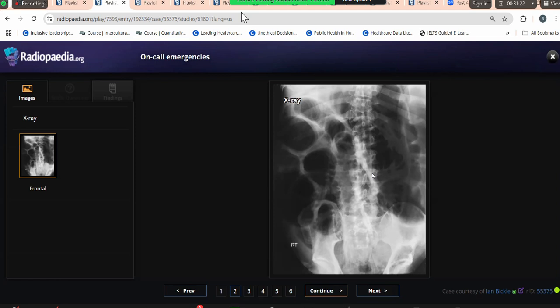So it appears to be obstructed. Yeah. So I would be thinking of the cecum, that it is arising from the left flank and extending towards the right side. This is in keeping with a distal large bowel obstruction, because I can appreciate both the large bowel as well as the small bowel, and I do not appreciate any free gas. However, in order to be sure, I would look at the lateral decubitus film if available.